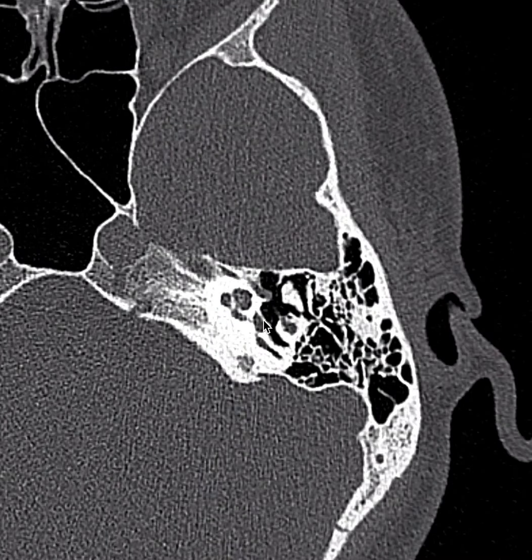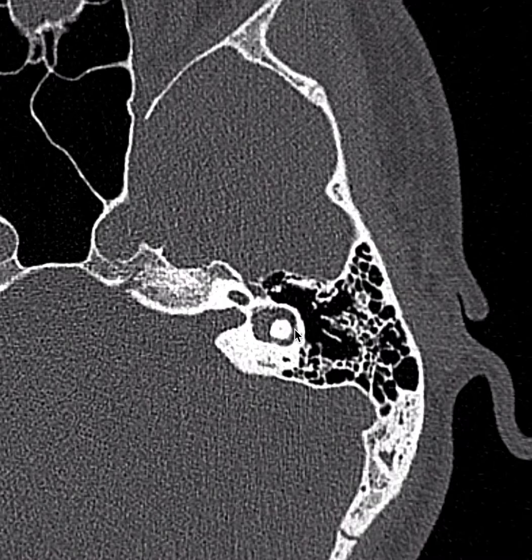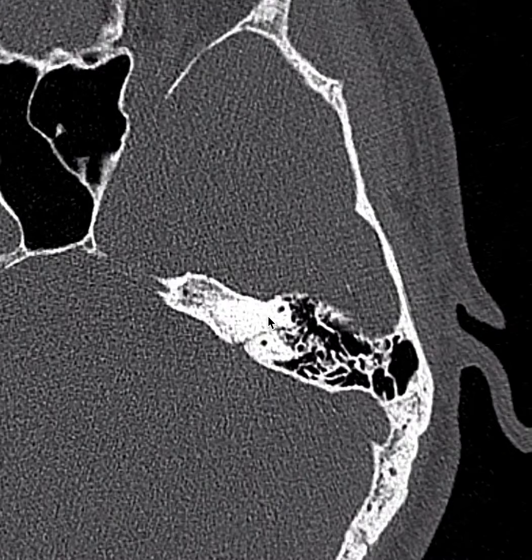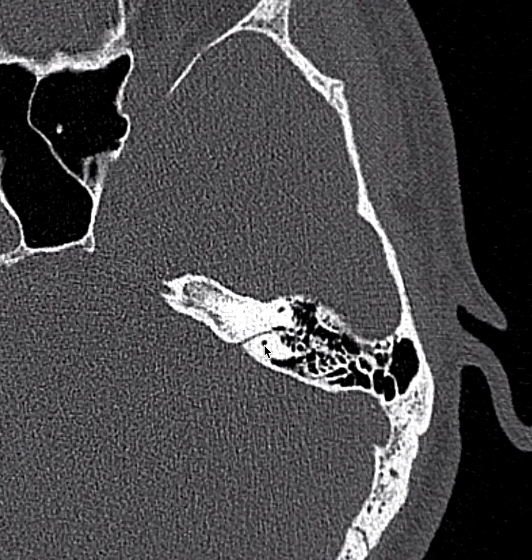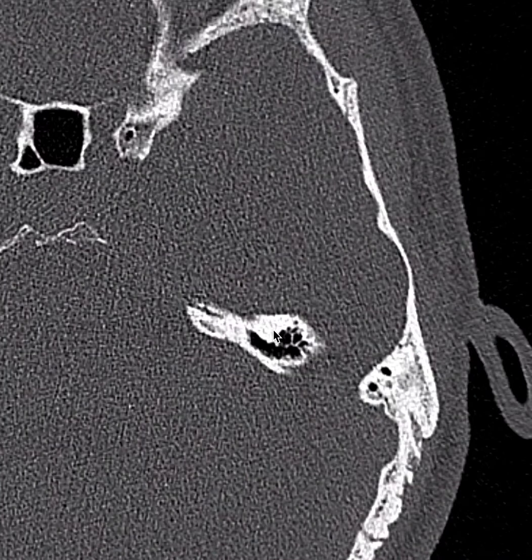Scrolling superiorly now, we're going to reach our internal auditory canal right here, and the vestibule here. The lateral or horizontal semicircular canal is seen here. As I scroll superiorly, we'll see our superior semicircular canal with its anterior and posterior limbs, converging superiorly right here. The bone here is called the arcuate eminence.